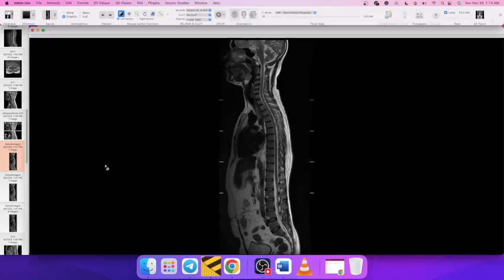Okay, so today we will discuss how to report a lumbar spine. Now, the first image which we should see in a lumbar spine is the scanogram image, or the whole pasted image, multiple names. Basically the entire vertebral column should be seen so that we can do numbering and check for lumbarization or sacralization.